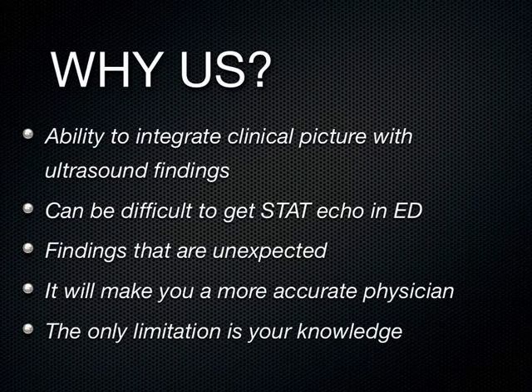We had a case of this just recently, two days ago, in a patient who came in with fatigue. I just reviewed it today during QA. The students were looking at the gallbladder and other structures, and there's a great ultrasound image of them looking at the gallbladder, but off in the distance towards the bottom of the screen, you can see a big fluid collection with the heart beating in it. Then they focused on the heart, and this was pericardial tamponade, and the patient went to the cath lab and had a pericardiocentesis done as a cure to their fatigue.